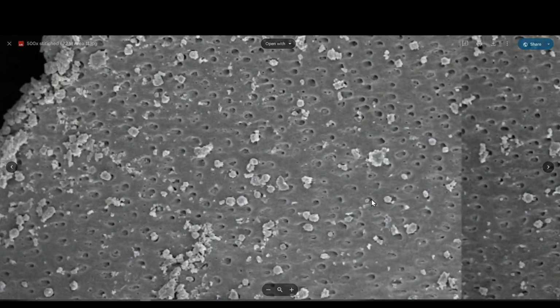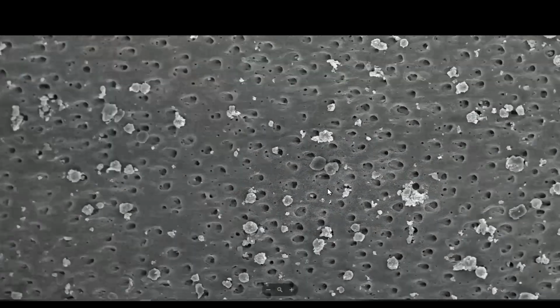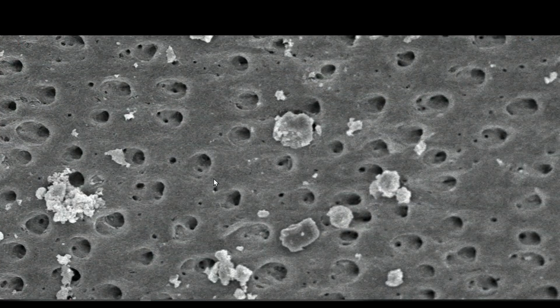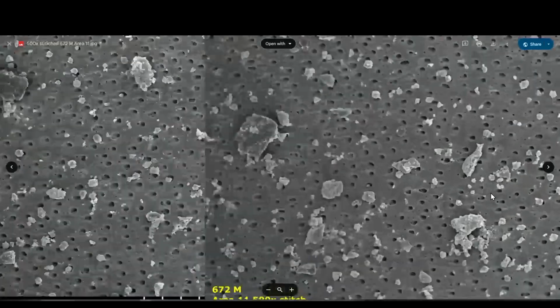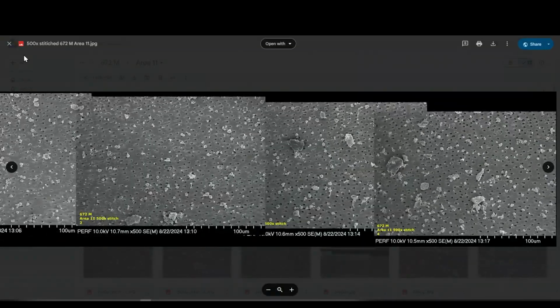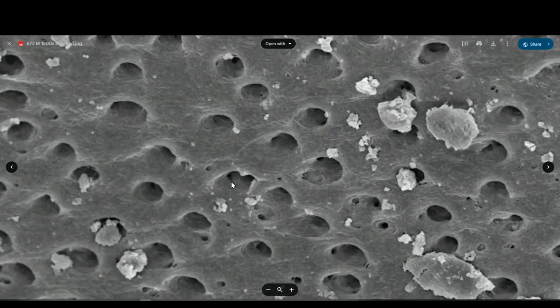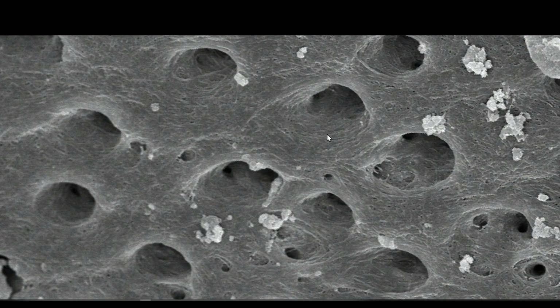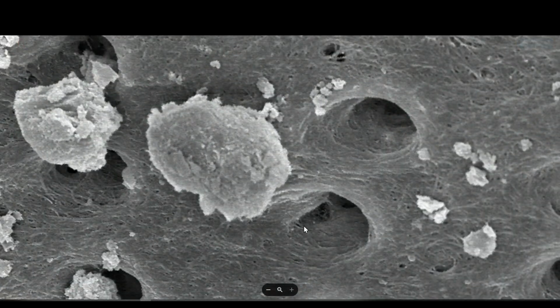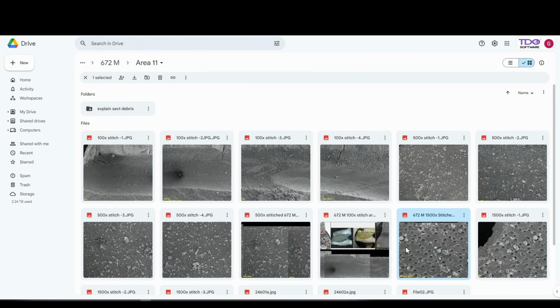This is a higher magnification view of that virgin canal, and you can see the effect of the irrigation device, the GentleWave, here on this, and it looks like the peritubular dentin has been pretty much removed. There is some predentin material still left, but it really looks kind of like the promotional material for the device. And there's been a considerable demineralization of the mineralized front with only very minor predentin present.